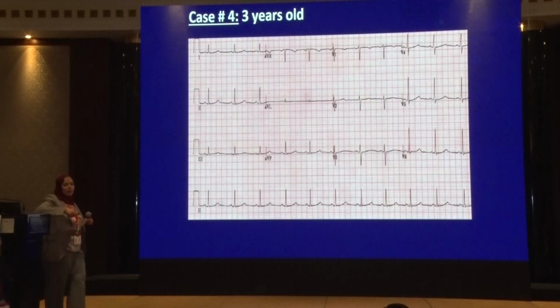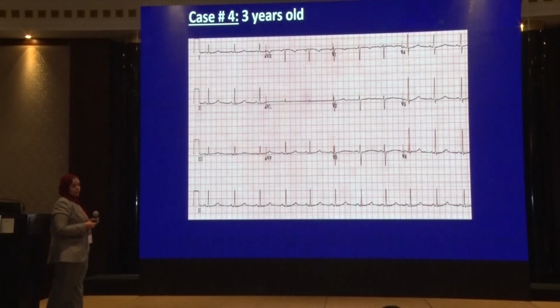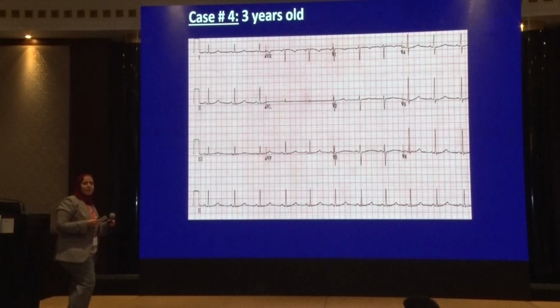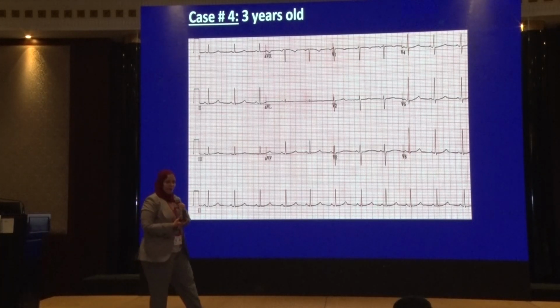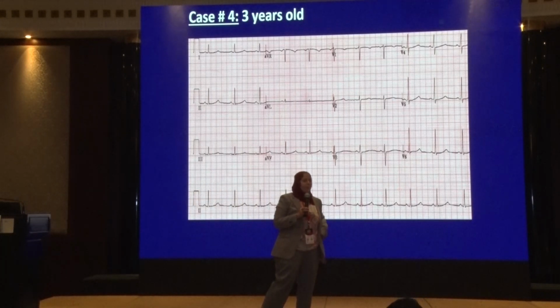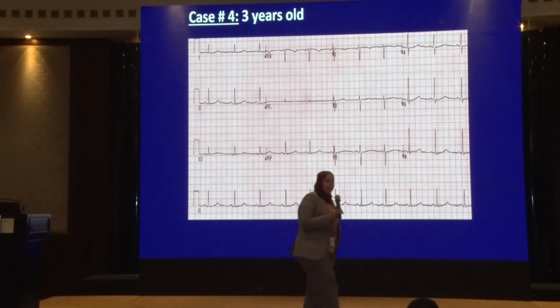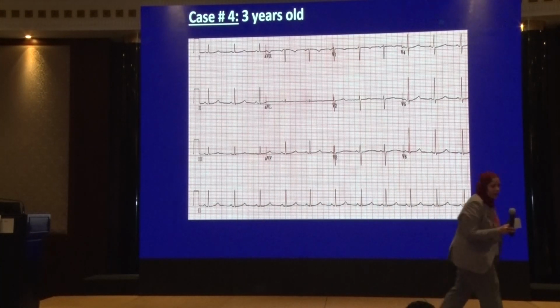Who calculated? Oh, 511. Who agrees? Because this is serious. Dr. Omar wants to send the patient for genetic testing, and he wants to have a full genetic evaluation of the family. He wants to have full relative screening by echocardiography. He's seeing some serious things. So he needs supporters. Anyone? Doctor?